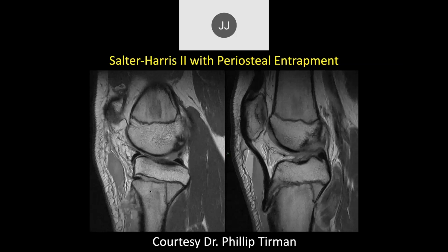What has happened in this fracture is that the physis opened up and sucked in the periosteum. If you look at it, there's a little bit of a difference in measurement of where the periosteum is versus where the fracture is in a tibia, in a proximal metaphysis area. I mean distal metaphysis.